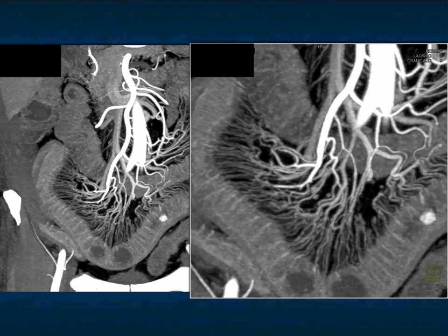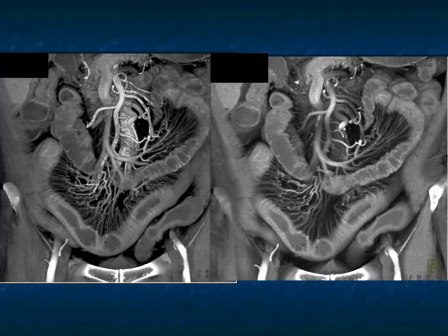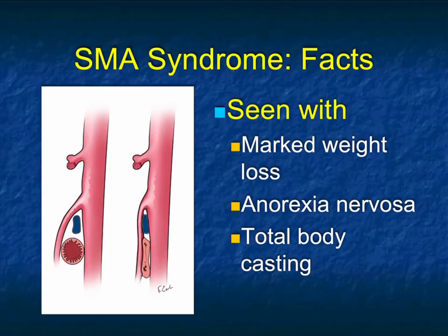And then when we go to the MIP imaging, you see the wall thickening of bowel, but you particularly see the prominent vasa recta, not diagnostic of Crohn's disease, but very common in Crohn's, and also telling you the patient's disease is active. And here, as we go from MIP to volume rendering, we again see the prominent vasa recta, but volume rendering is much better at soft tissue imaging, so you really have a good appreciation of the wall thickening of the patient's distal ileum.